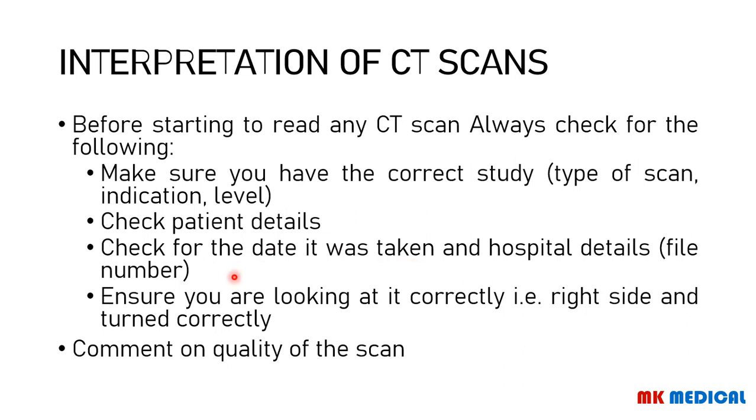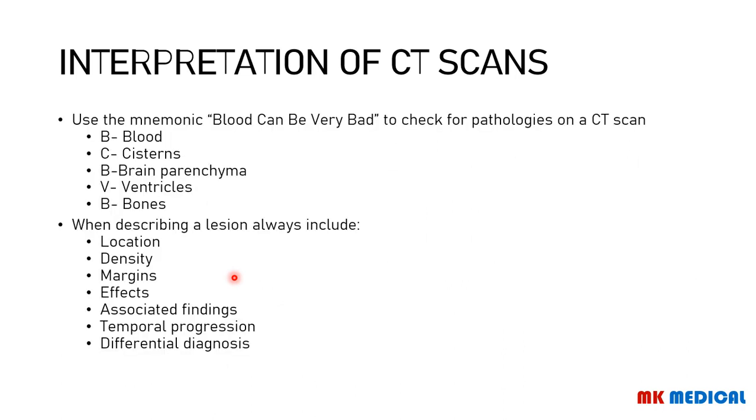Then ensure that you're looking at it correctly. The right side should be where it's supposed to be, the left side should be where it's supposed to be, and up and down should be where they're supposed to be. So get your bearings straight. Then comment on the quality of the scan. Is it a good quality CT scan, or does it have some artifacts on it, or is it a poorly taken scan?